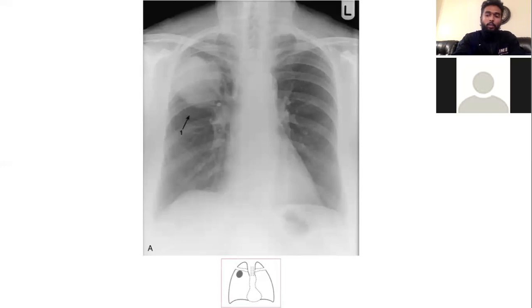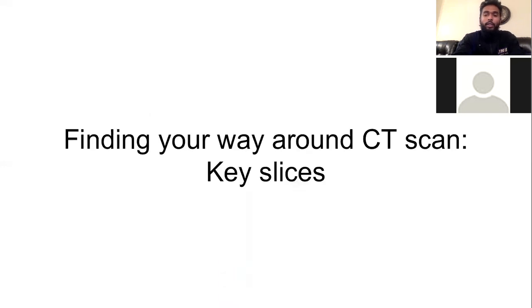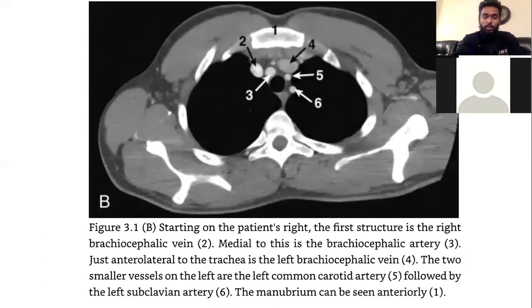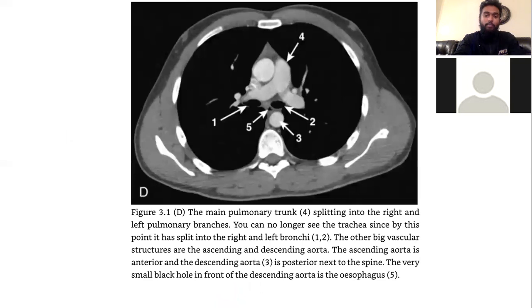What color do you think airways would be, like bronchioles and alveoli? I'd expect them to be dark, since they've got air in it. I don't think I should see them. Yeah, it's just going to be like that. That's all I'm saying.